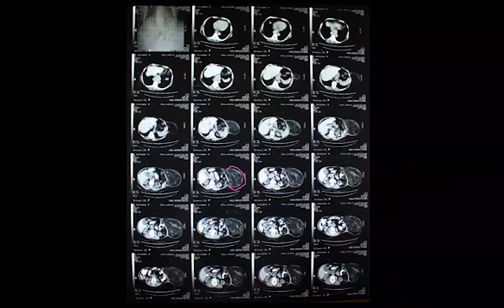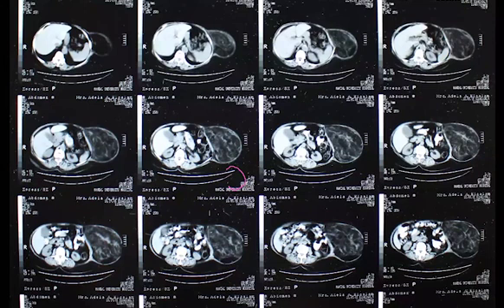Okay, let's zoom on one of the images. Can you tell me what this is? It could be a lipoma. Yes, lipoma, bravo. I would suggest this density of fat and a bit of hyperdensity is no problem. It's lobulated. Absolutely, it could well be a large lipoma. But in order to say lipoma, you need to check the density of the fat. You have to be very clear about it.